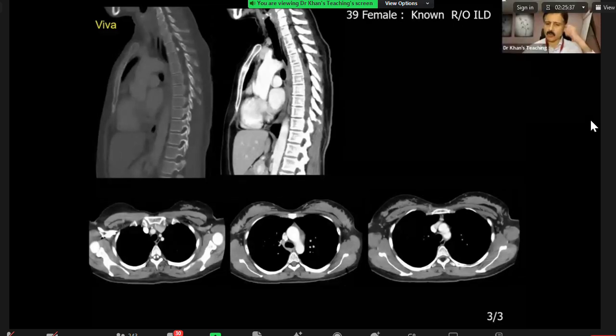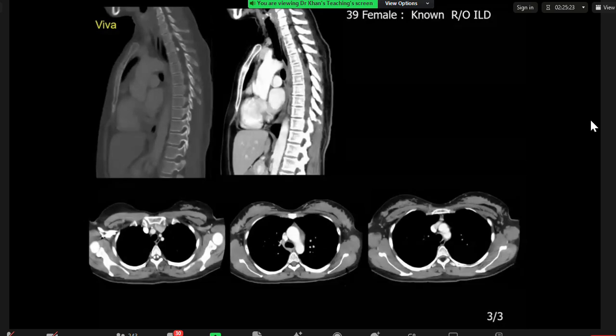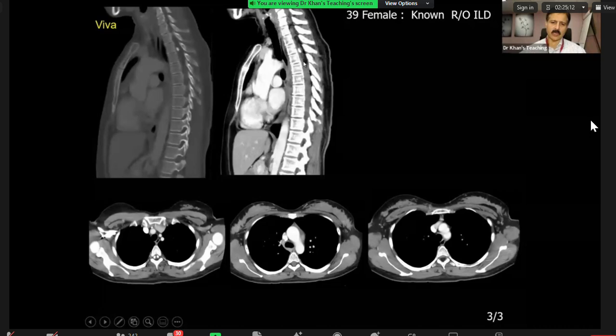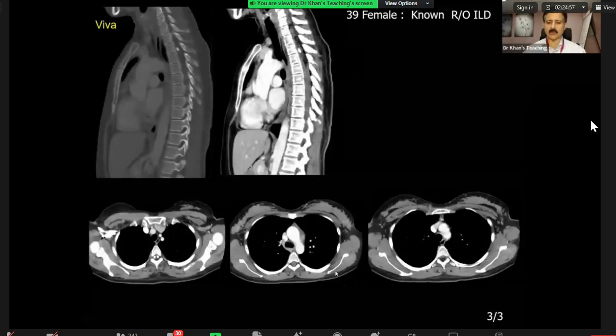So what can you do to evaluate further, just on the CT, I mean to say? If they had, this is a contrast enhanced, isn't it? So I would look at the pre-contrast, if there was one available, to compare just on CT alone. Ideally, it would be great to evaluate on MR, but can you see this density and compare with this subcutaneous density? Overall, it's quite a low, heterogeneous looking cord lesion with potentially calcification and fat density. Okay, so my question was very basic. How will you check the fat?